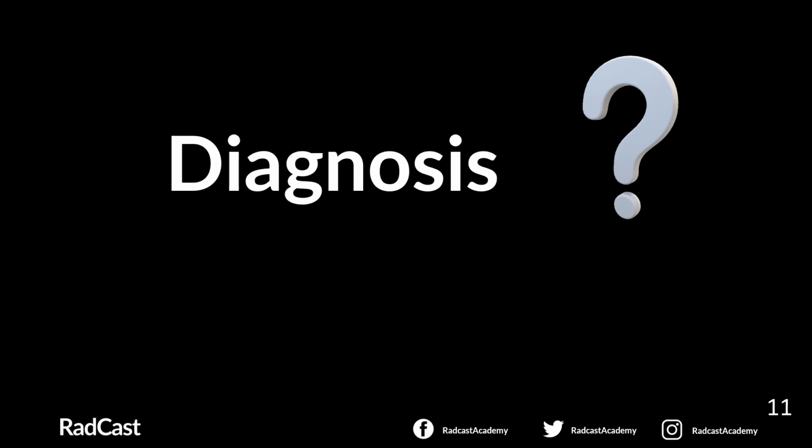How can we diagnose subarachnoid hemorrhage? Specifically, we will talk about imaging features. The diagnosis of subarachnoid hemorrhage usually depends on clinical suspicion combined with radiological confirmation by doing an urgent brain computed tomography scan. If the CT scan is negative, what can we do? It is followed by lumbar puncture to detect the presence of blood products in the CSF.